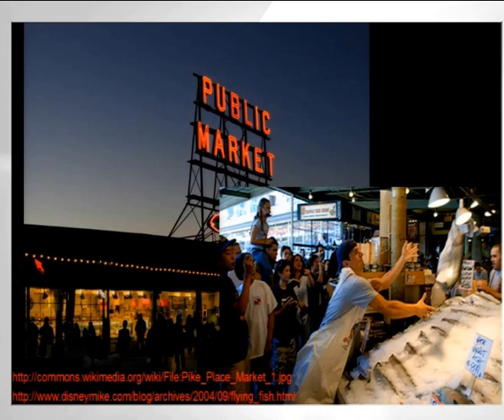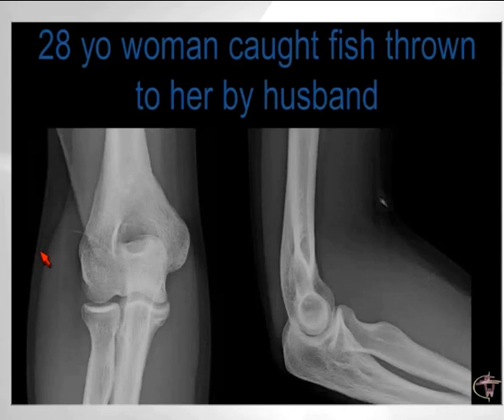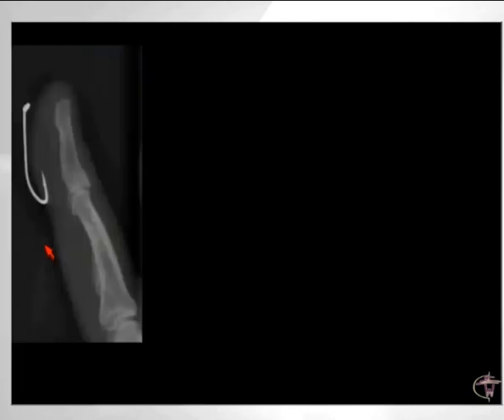In fact, this is so popular that once or twice a year the public is invited to participate in a fish throwing contest. And this is exactly what this young woman did, and her husband threw her a salmon, and she caught the salmon, but unfortunately the salmon pierced the antecubital fossa, and we see on the elbow radiographs that were obtained in our emergency department that there's a bone in the soft tissues. Easily recognized on radiographs, subsequently removed. She went on her vacation.